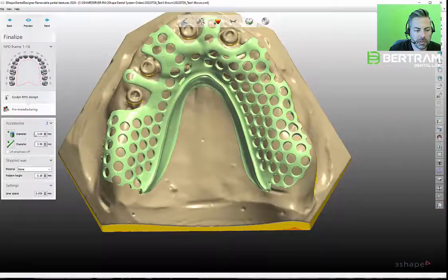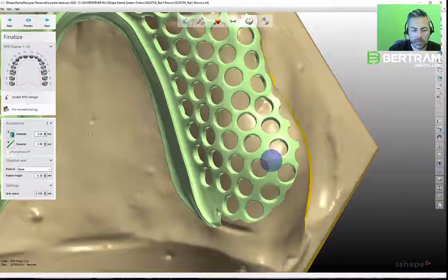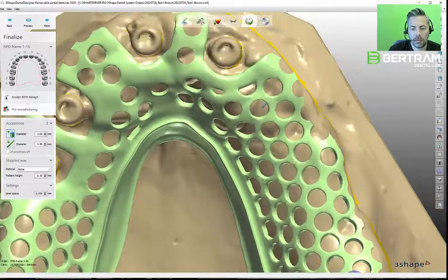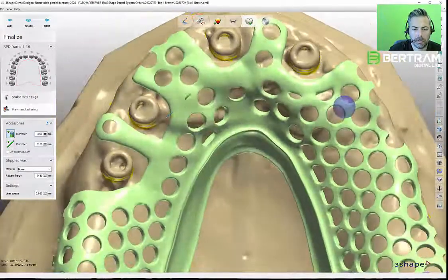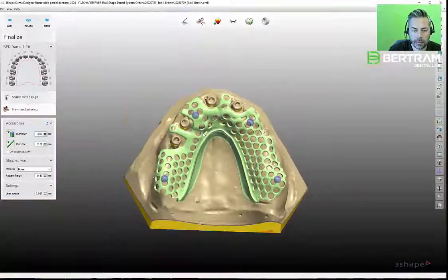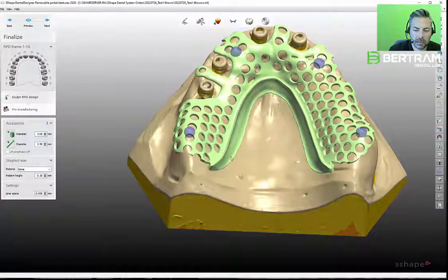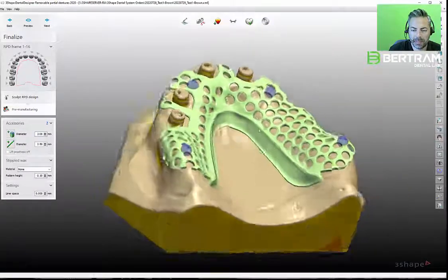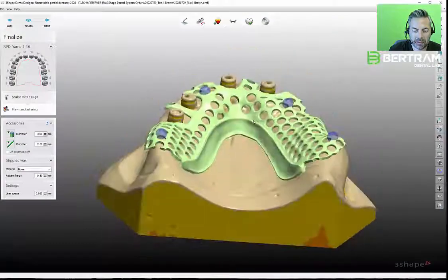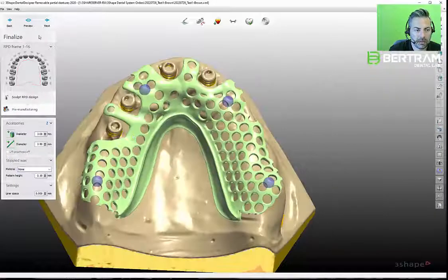And our default tissue stop, we do a 3mm tissue stop. I'm going to put that in a posterior. One there, and I would do right about there. This is our default for printing: we do a 0.050 for a line spacer. On this particular one, I don't want stippling on this small exposed horseshoe, because by the time we polish that out, there's basically going to be none left. It's too small, so I'm going to keep that smooth, no stipple added, and that should be it.